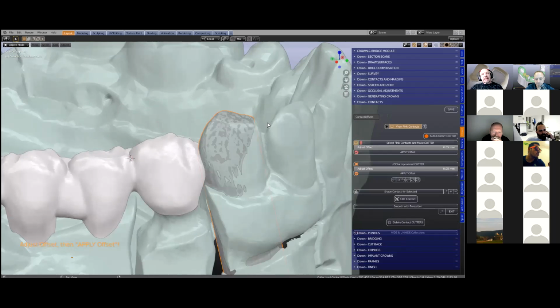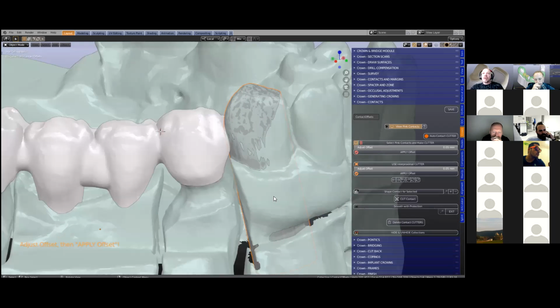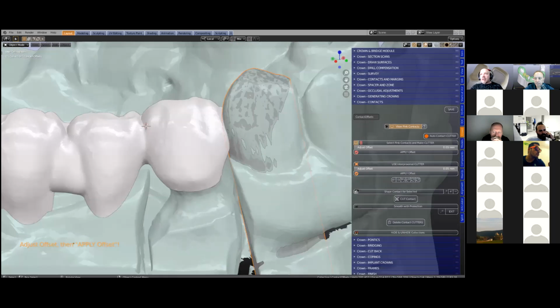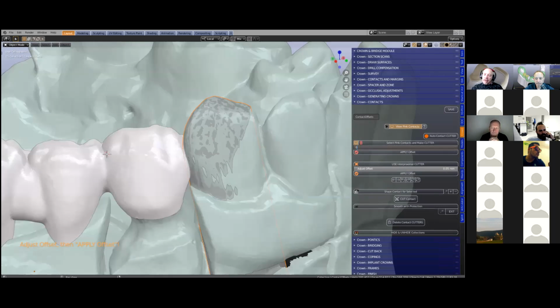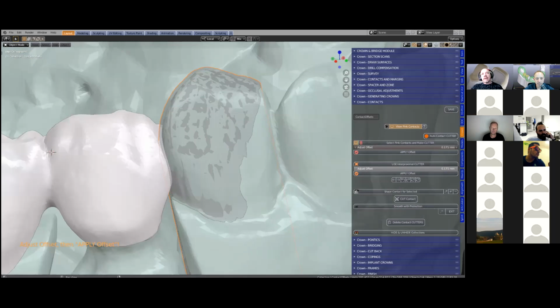This has taken it from our path of insertion right at the beginning when we surveyed the model. This is offset at 50 micron. We can change it, so if you wanted 100 micron, we can change that. As we're clicking here, this actually grows outwards, and this is going to be our cutting tool.